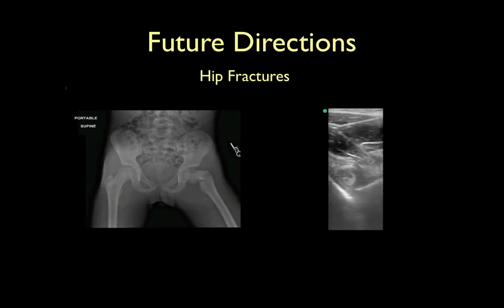A study by Safran and colleagues published in 2009 in the Journal of Ultrasound in Medicine suggested that sonography may have a role in detecting hip fractures that are not identified with plain radiography. Although this child's fracture was quite obvious, Marshburn and colleagues found in their 2004 study in the Journal of Trauma that sonography may be limited when it comes to identifying fractures at or above the intertrochanteric line. Thus, more study is needed before sonography can be recommended as a sensitive enough modality to detect hip fractures.